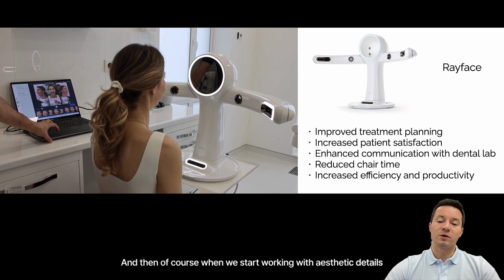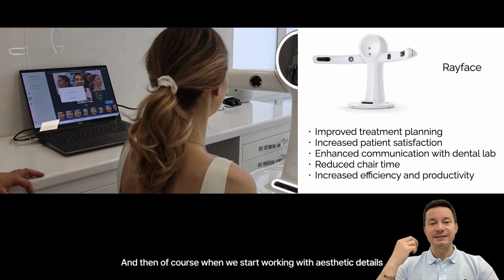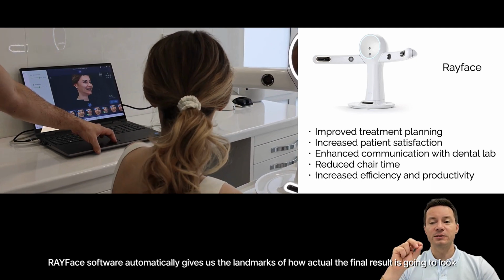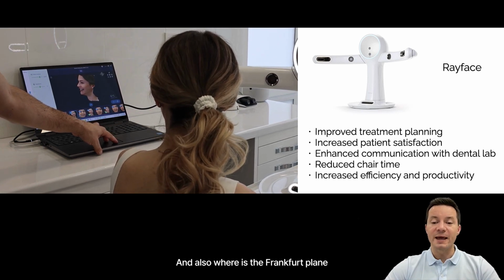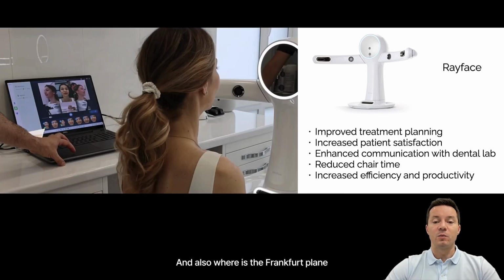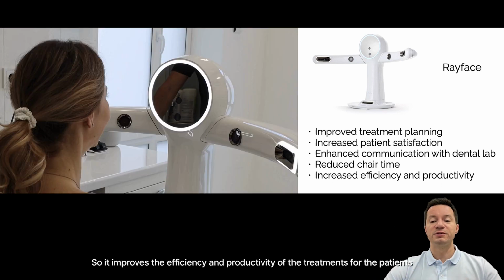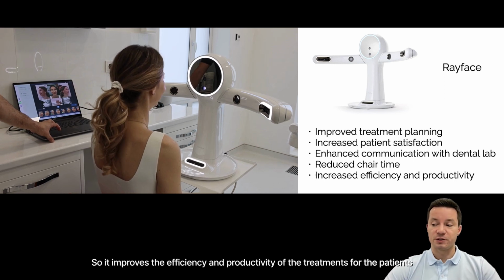And then, of course, when we start working with the aesthetic details, Ray Face software automatically gives us the landmarks of how actually the final result is going to look, and also where is the Frankfurt plane. We can see what is the sagittal position. We can see where actually are the condyles of the patient. So it improves the efficiency and productivity of the treatments for the patient.